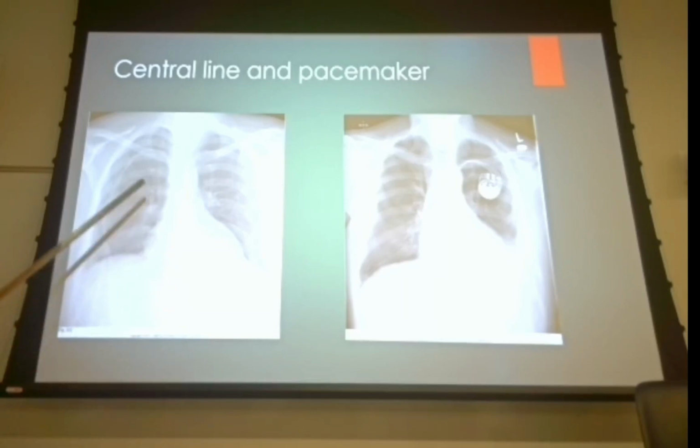So if it makes a left instead of a right and it's going up, it's probably going into the jugular vein, right? So which way is the blood going? Down. It's going down. So if they're putting medicine into this and it's going up into the jugular vein, what's going to happen with the medicine? Is it going to go up into the brain and mess the patient up? It's going to wash straight back down, right?